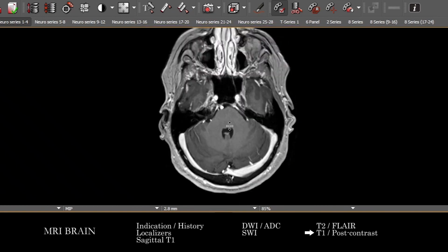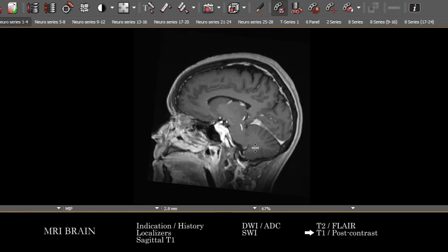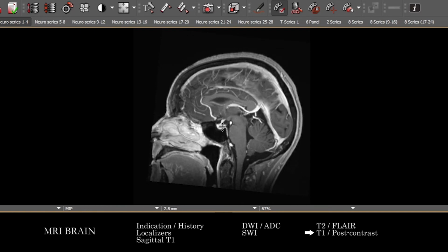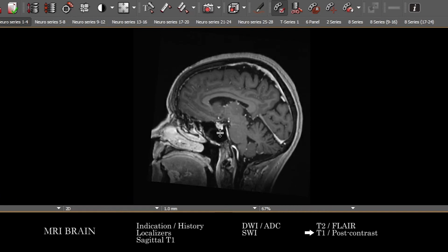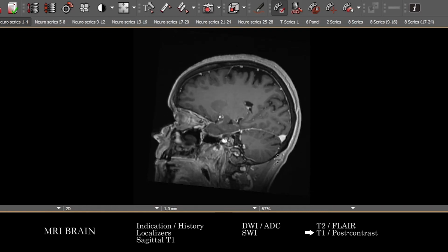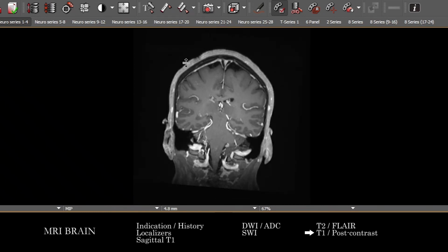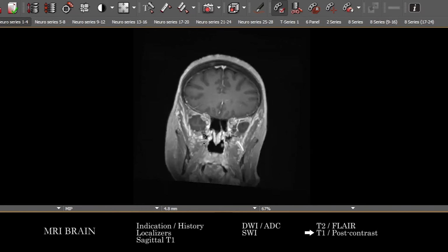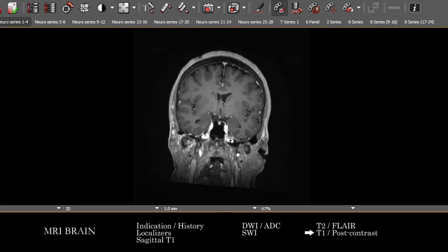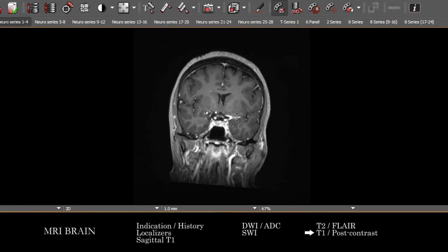Okay, we're going to do that through each lobe of the brain, and then using each projection, such as the sagittals, is going to be particularly good for the skull base. We're going to return to the pituitary gland in the sellar suprasellar region for looking for abnormal enhancement or mass lesions there, particularly the skull base, looking in the pineal region as well, and just sorting out points of anatomy such as in the face and upper neck that are better visualized on the sagittal projection, and then on the coronal, similarly looking at particular areas near the vertex, near the skull base, in the face, or areas at the periphery of the intracranial compartment that are more difficult to sort out on the axial and sagittals.